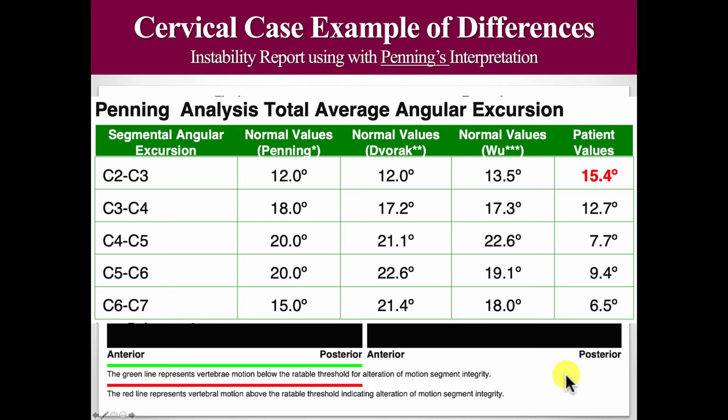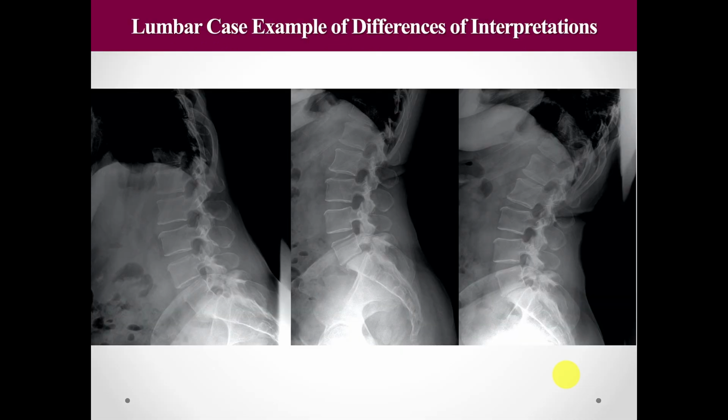Pennings assessment. So technically, you have a lot at your disposal. You have the posterior tangent method, you have Pennings, you have the 5th edition and the 6th edition interpretation of your patient's spine. So I wanted to find a good lumbar case. So this is a good example in a lumbar with these methods. So they have a spondy. Doesn't appear that it's moving too much.